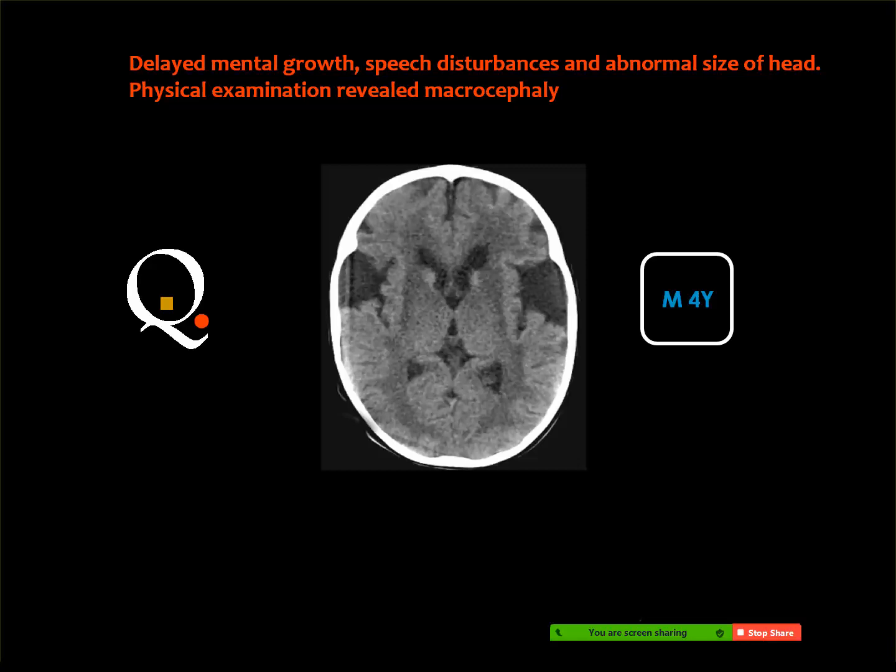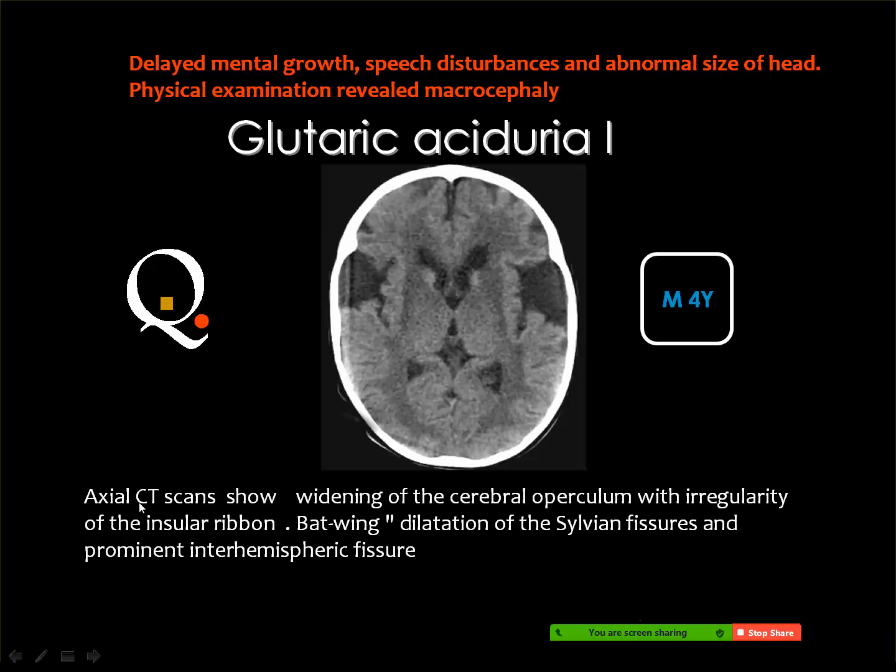What do you think? Schizencephaly? No. The same case, approximately? No. Glutaric aciduria. Yes, and this is glutaric aciduria type 1.